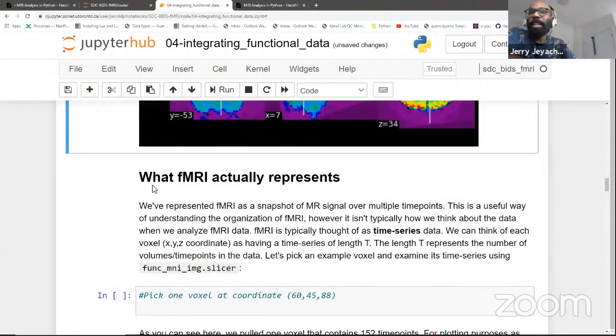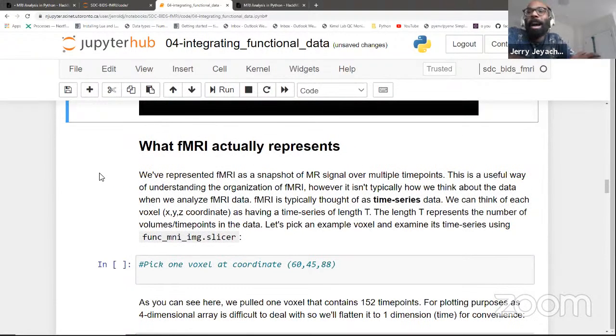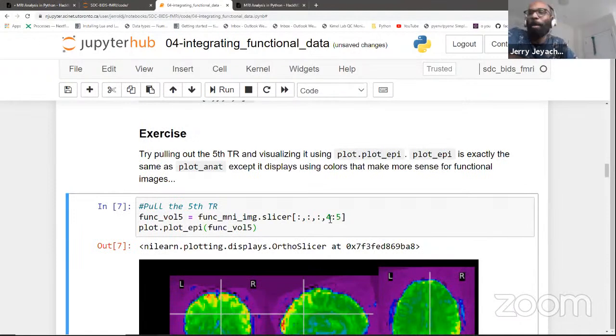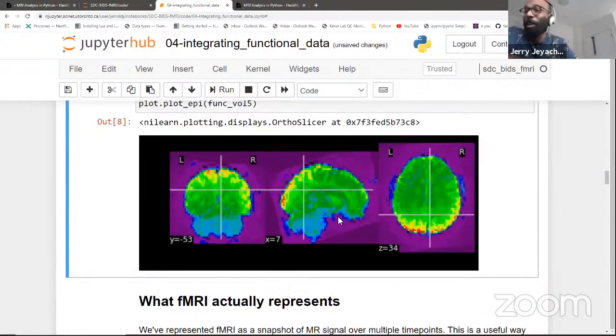All right, so a question that might be asked is, using 4 seems to give me the same image? Hey, if 4 works, we've updated nilearn across this workshop and many times that we've taught it. So if 4 works, it looks like it does work. So maybe you don't need the 4 to 5. So if that works, great, that's perfect.